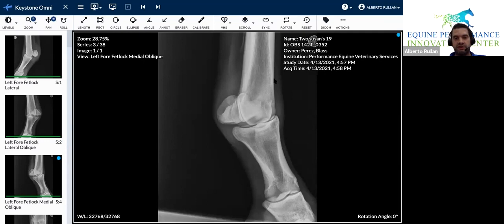All right, so here the same thing. We go on distal MC3, we go down, we go to the condyle. Racehorses will get a lot of disease right here in the palmar condyle. They will get sclerosis on this area. Sometimes they get little fragments. Then we go up MC3, checking for the splint. Don't forget the splint. A lot of people forget the splint bone over here. Then we have the medial sesamoid, looking for sesamoiditis, fragments or fractures.